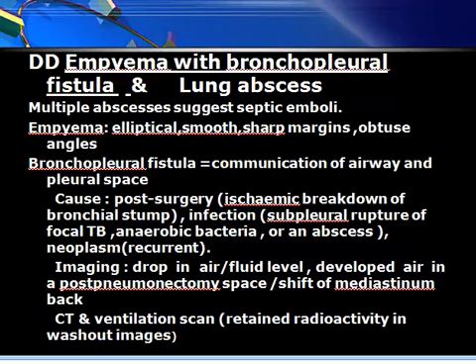Empyema and bronchopleural fistula and lung abscess. Multiple abscesses suggest septic emboli. Empyema is elliptical, with smooth margin and obtuse angles. Bronchopleural fistula, as we said, obtuse angles. Bronchopleural fistula is communication with the airway. It will not stop except if you do surgery.